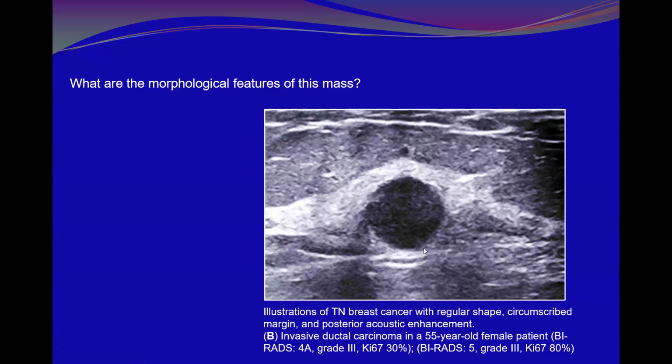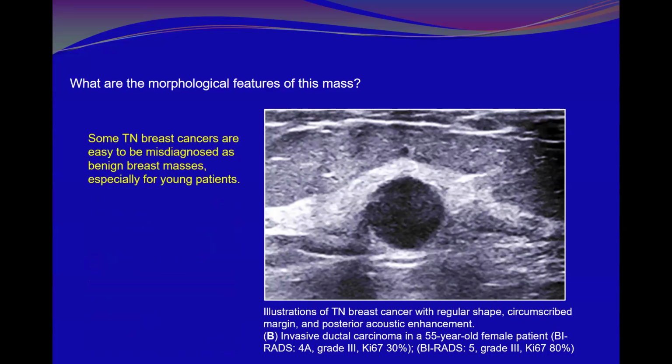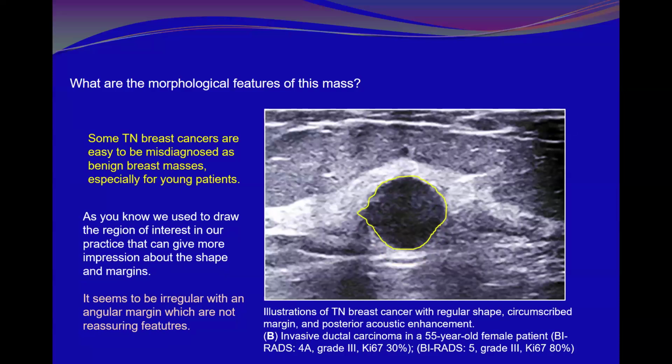But for me, I might say, yes, it may be rounded, but I have doubt about the margin. Do you remember, Suhair, we used to draw the region of interest in our masses?